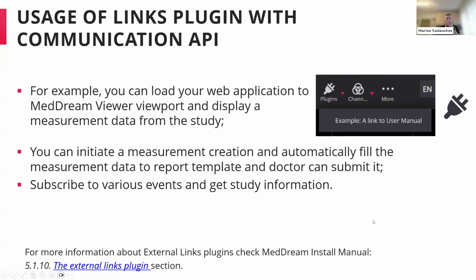Using this links plugin, for example, you can load your web application into the MedDream Viewer viewport and display, for example, measurement data from the study, or you can initiate some measurement creations through your system.